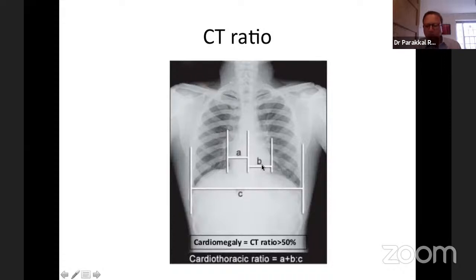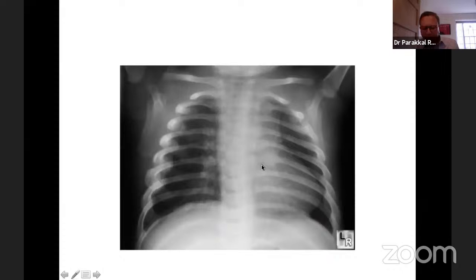Yeah. And my final slide, I haven't put any title on this. So this is a 6-month-old who presented with a sudden episode of 24 hours of being unsettled, crying, and struggling to breathe at times. And we did a chest X-ray and couldn't really work it out. There were no major cardiac issues, no major respiratory findings, until somebody then pointed out and said, if you look closely, if you look there, what you can see there are rib fractures. Okay. So this is a healing rib fracture.